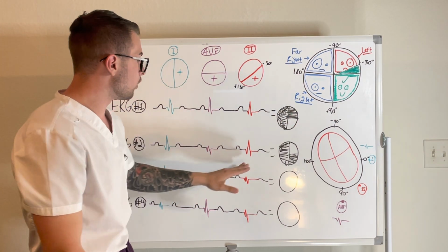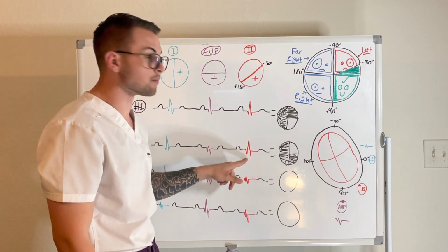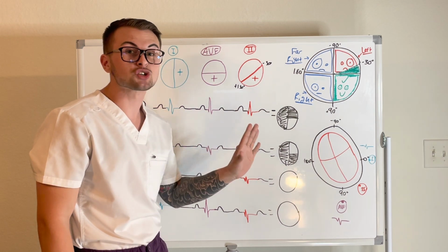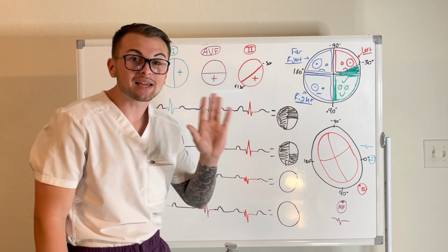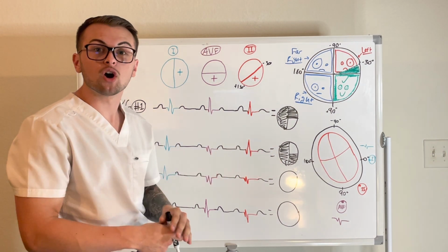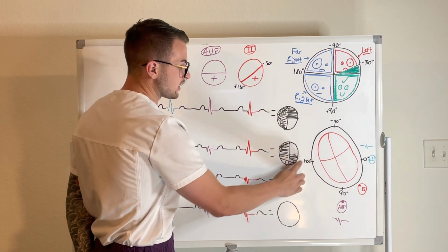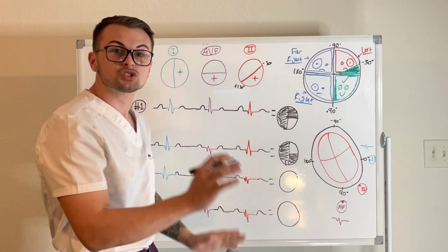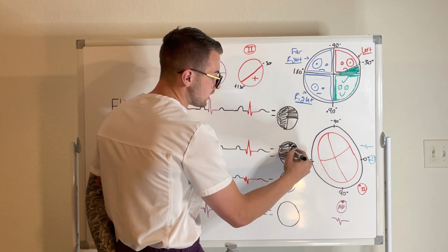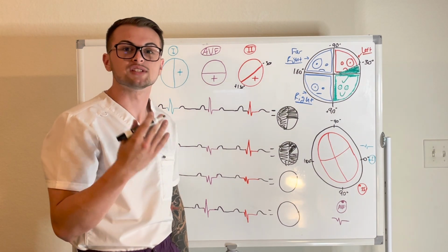So what do we do? We look at lead 2 on our EKG, and we see that it is mostly positive. So we know that the electrical axis must be headed toward lead 2. In other words, we know that the axis points between -30 and 150, right? -30 and 150. So we know that it can't possibly be in the left quadrant. So let's put it all together.